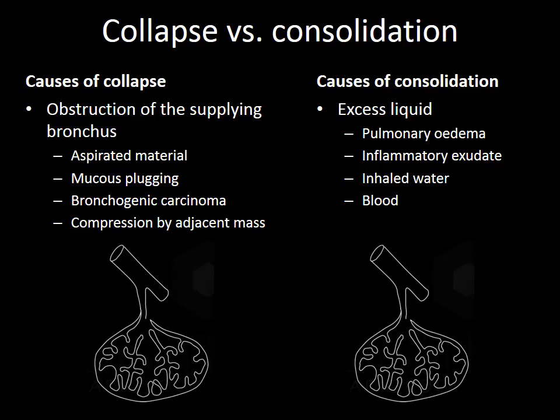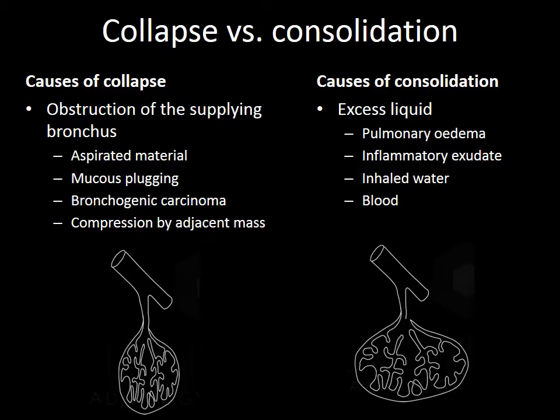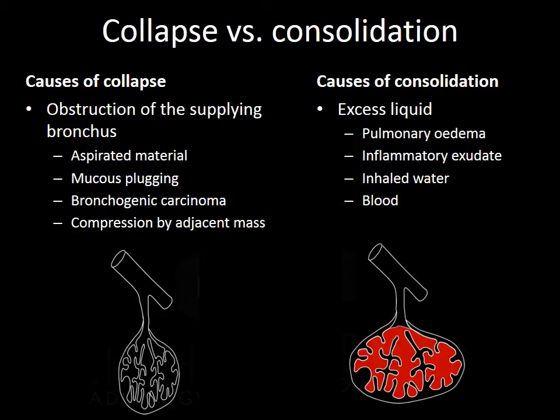Pneumonia. In practice, the words collapse and consolidation are often used interchangeably. This is careless, incorrect, and leads to confusion. Collapse involves loss of aeration of the air spaces. Consolidation involves fluid filling the air spaces.